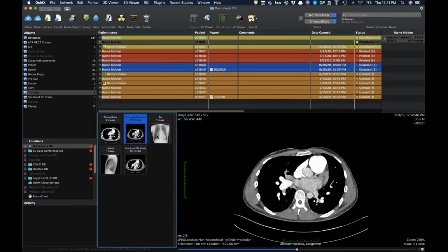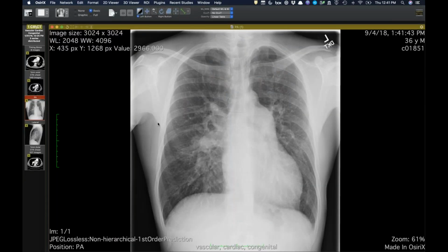This is a fun one. So Travis, do you think that this was diagnosable on a chest radiograph with lymphadenopathy being visible, that previous sarcoid case? Good question. There was no radiograph. This is one of those that went straight from spinal MR to PET and then to CT. Got it. But certainly it looked like it would have been a pretty typical radiograph in a patient in their 30s, sure.